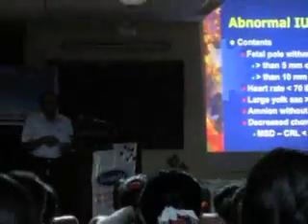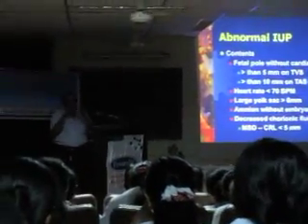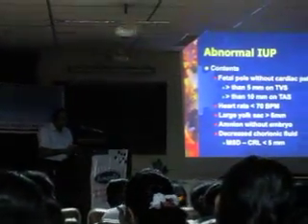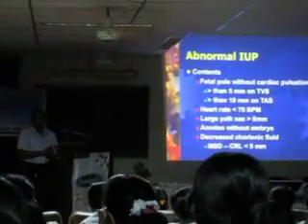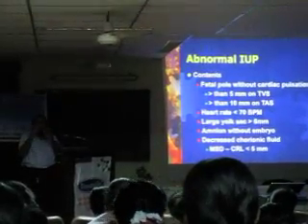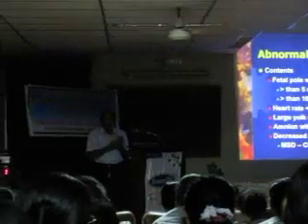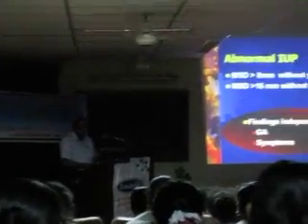Because you know that it is around the bilaminar germ disc that the amnion is actually forming. So if the amnion is formed and there is no germ disc, then obviously it is abnormal. And decreased chorionic fluid: sometimes you can see the fetus is tightly packed, so early in pregnancy there is no chorionic fluid at all. That also can result in a failed pregnancy.